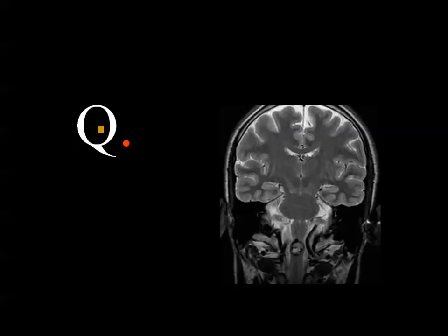Coronal T2 of the brain. Mesial temporal sclerosis, right? On the right side.